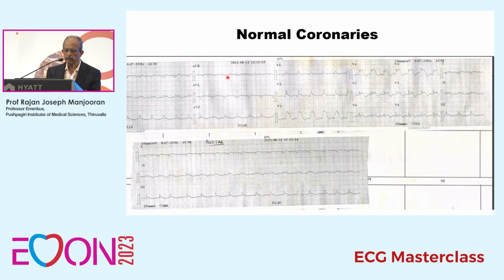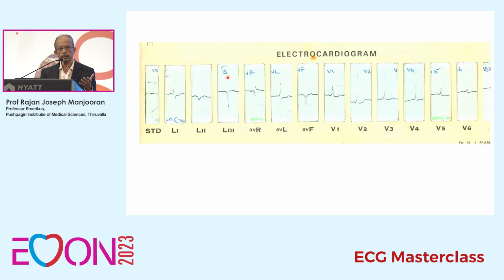This patient has extensive ST elevation in all leads with no reciprocal changes. And we did a coronary angiogram, the patient had normal coronaries. So you have to think of conditions other than ischemic myocardial injury. It could be an infection like myocarditis, or it may be a stress cardiomyopathy. So if there is an extensive ST elevation without reciprocal change, that may tell you that the patient may be having something different from acute myocardial infarction.